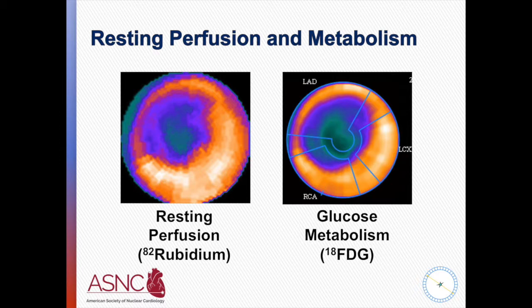And if he does poorly, he might be considered for transplantation or LVAD, those kinds of advanced treatments. But myocardial revascularization would be unlikely to benefit him. He's got a normal right coronary, a normal circumflex coronary, and the LAD territory, based on this very sensitive test for viability, is really found to be mostly non-viable.